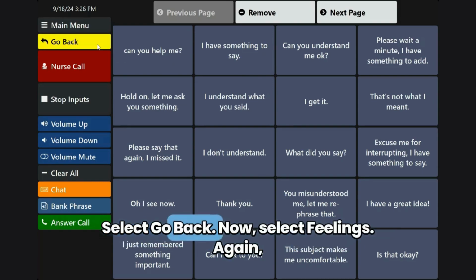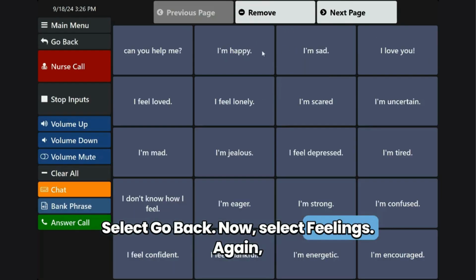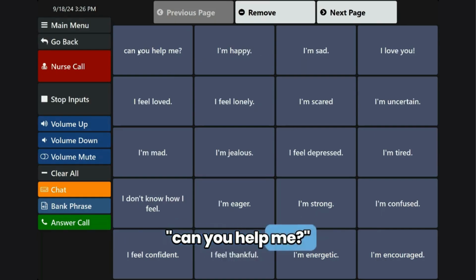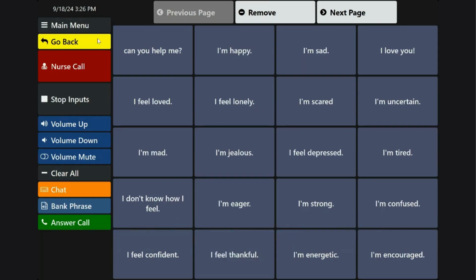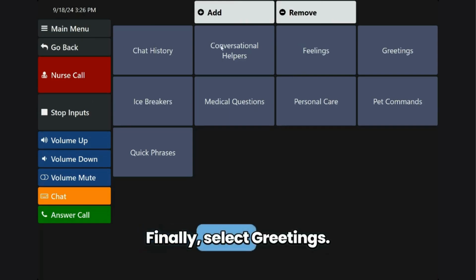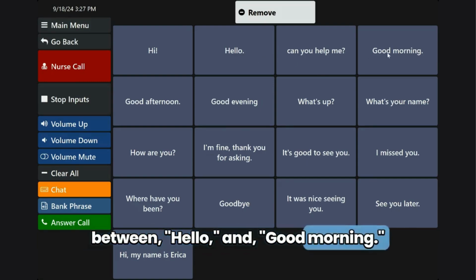Select Go Back. Now select Feelings. Again, Can you help me is up first. Select Go Back again. Finally, select Greetings. There it is, Can you help me, in the third position just between hello and good morning.